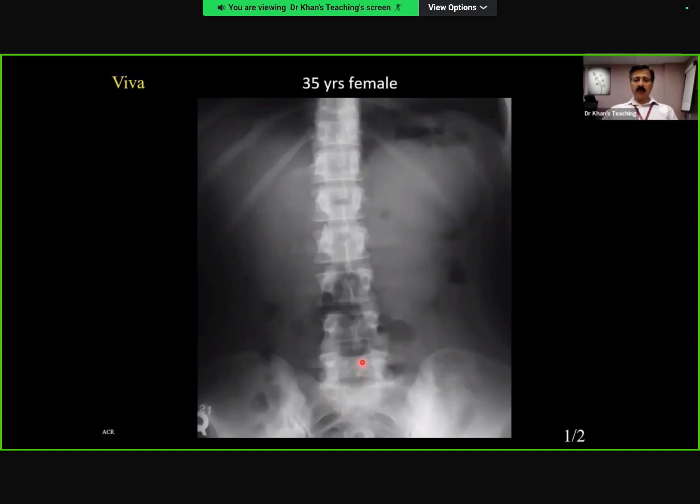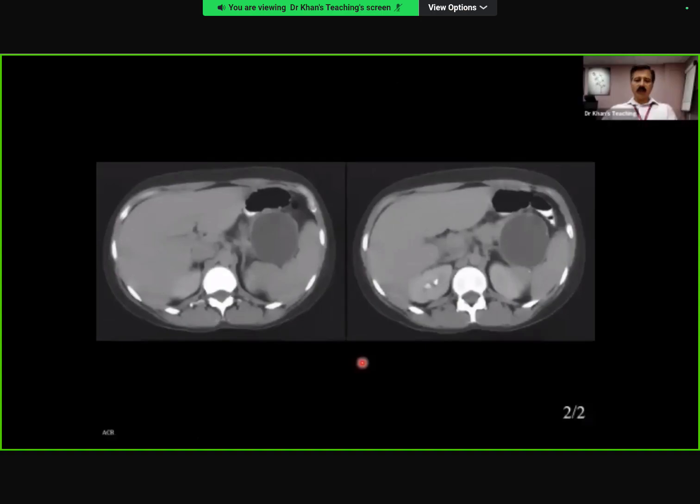And what kind of pancreatic lesion comes to your mind? As big as that. So a pseudocyst. Brilliant, well done. So this was a pseudocyst. So well done, candidate 3. We will go to candidate 4. Well done.